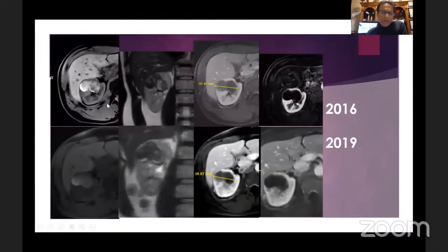This was a 50-year-old patient, shows an ugly-looking bilobulated lesion with hyperintensity on T1 pre-contrast weighted images. Even on T2 weighted images, the lesion looks extremely ugly, but with IV contrast, you don't know whether this lesion is enhancing or not, but on subtraction images, you can clearly see that this is just a hemorrhagic lesion. There is no abnormal enhancement within it.